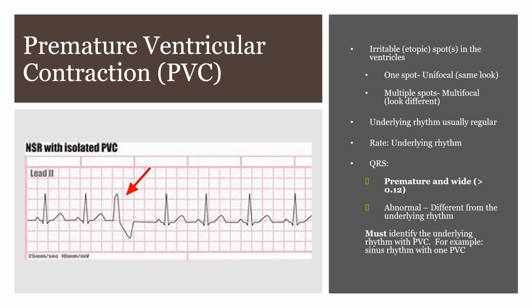So if we think about something being elicited or started in the ventricles, we know that corresponds to the QRS complex, right? So our premature ventricular contraction won't have a P wave, because a P wave would mean it was coming from the atrium.